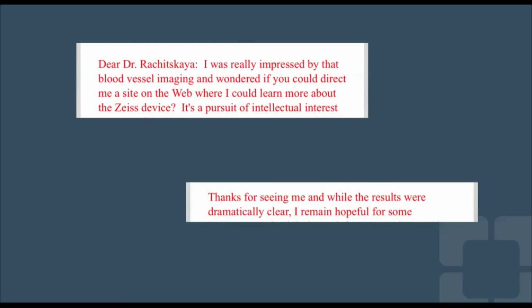And obtaining images where we can show those abnormal blood vessels, where we can show non-perfusion, and showing the normal. A lot of times I just go to a website search engine and put in normal OCT-A or normal FA and show, okay, this is normal and this is your eye. And you don't have to go to medical school to tell me these two pictures don't look the same.